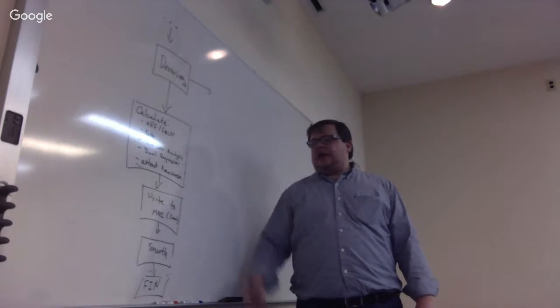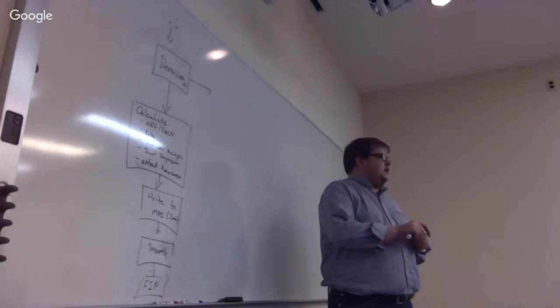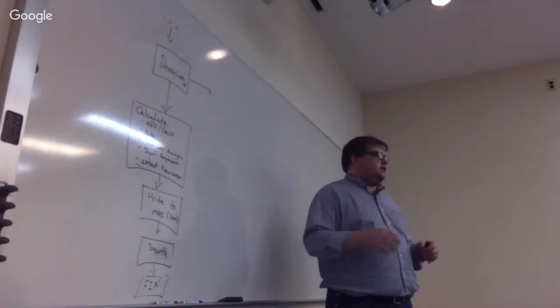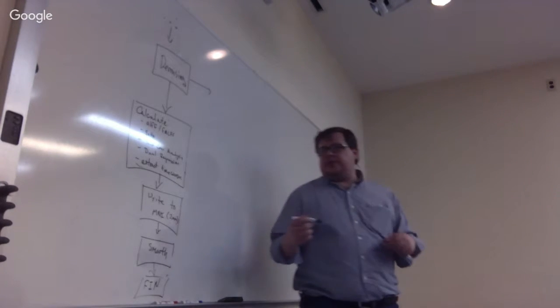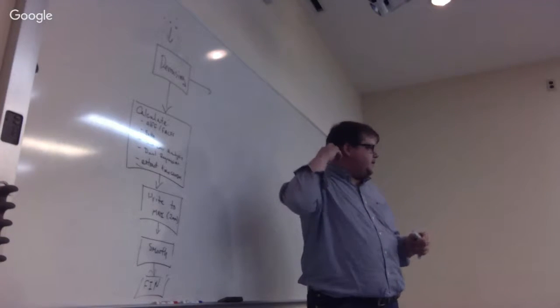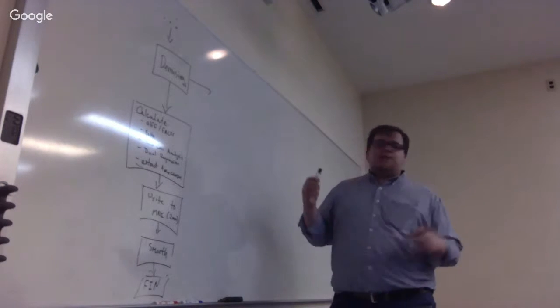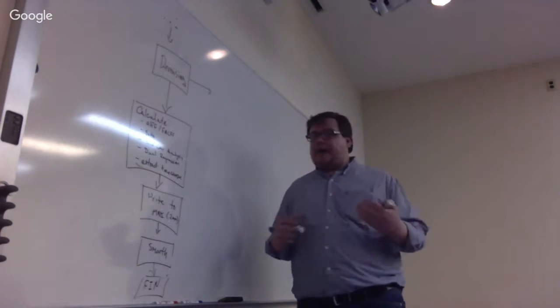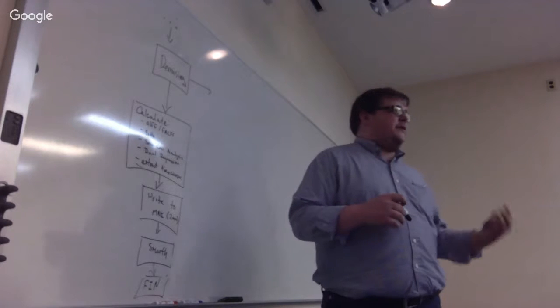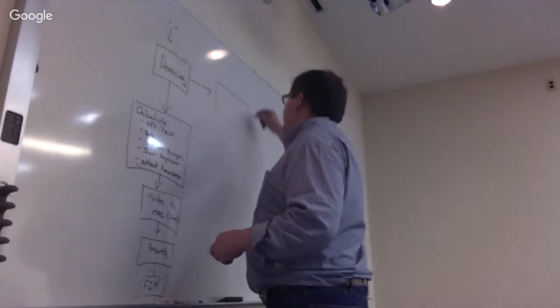And so, yeah, dual regression, I believe y'all are familiar with that. And so we can do dual regression as well. And with that, we do a similar thing where we copy to the resolution of those maps, so they should be big too. I'm sorry, similar resolution. So for other derivatives, it's actually better that we copy them into MNI space first, right? So there are some derivatives that we write into MNI.